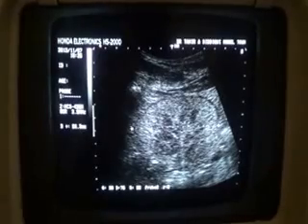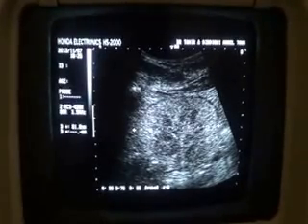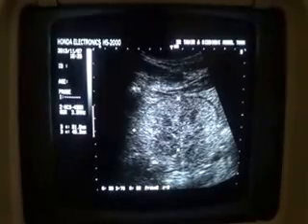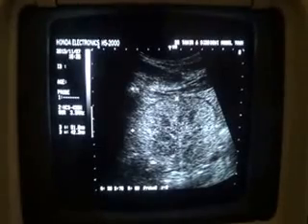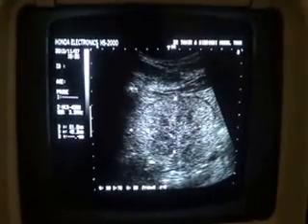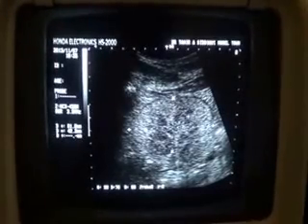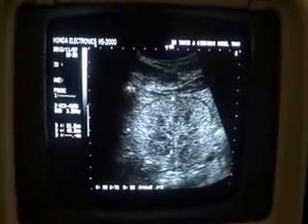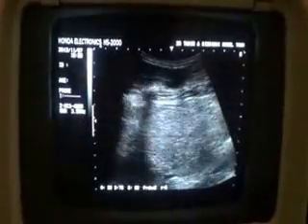The kidney measures 8.1 centimeters in length and 4.2 centimeters in anterior-posterior diameter, with no central sinus echo complex seen. It is totally muffled. No medulla is seen. However, a few dilated calyces are seen.